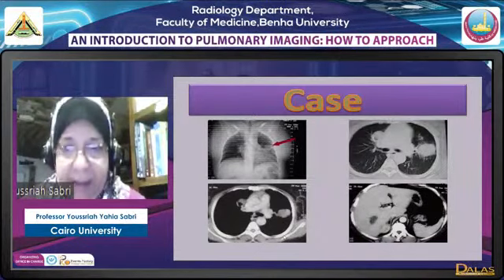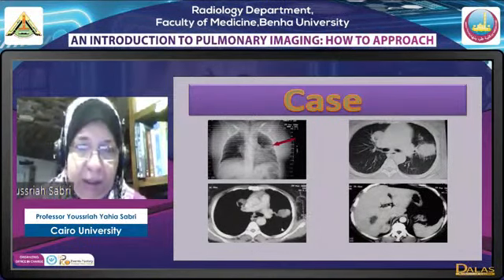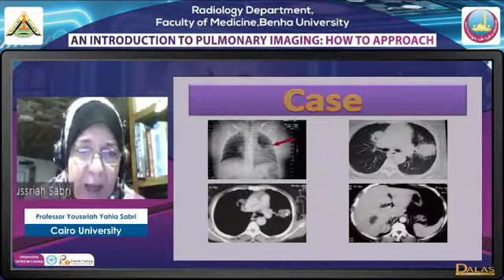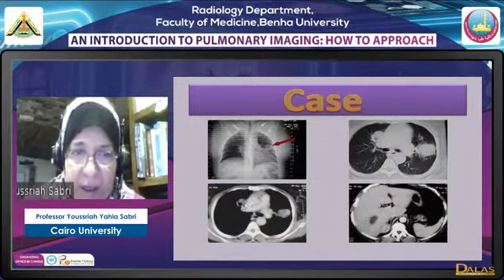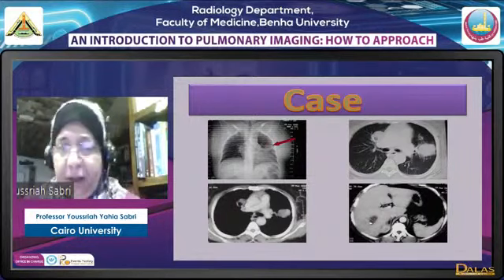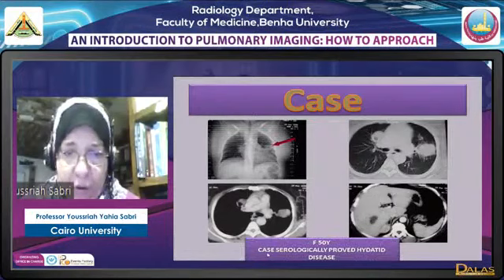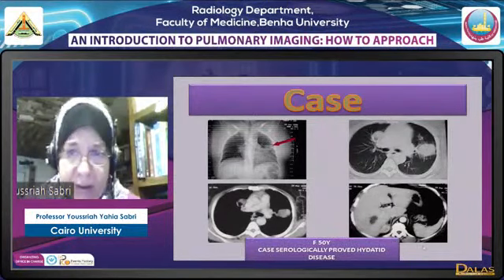Doing again, we must do the mediastinal window. Here the density is hypodense compared to the soft tissue of the chest. Okay. This is hypodensity. We're dealing with a fluid density. Again here a fluid density, and we found another lesion in the liver. We suspected hydatid, and actually the case was serologically proved hydatid disease.